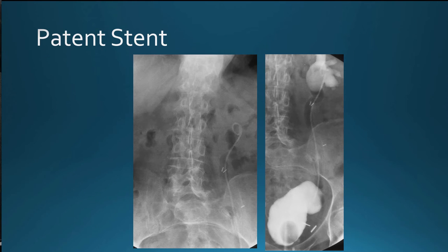The other method, maybe in my hands a more preferable method because of its binary diagnostic scenario, is that of a cystogram or loopogram.